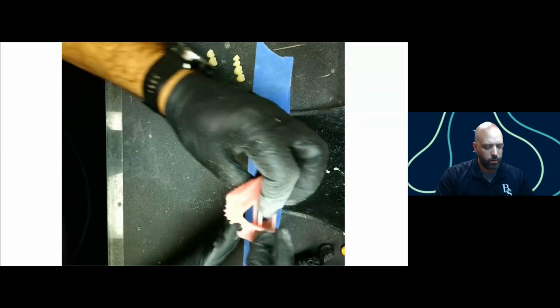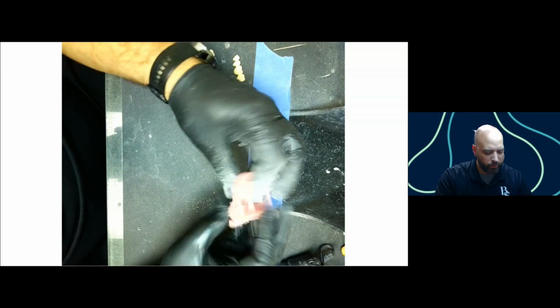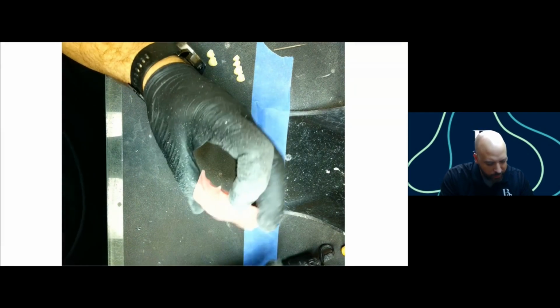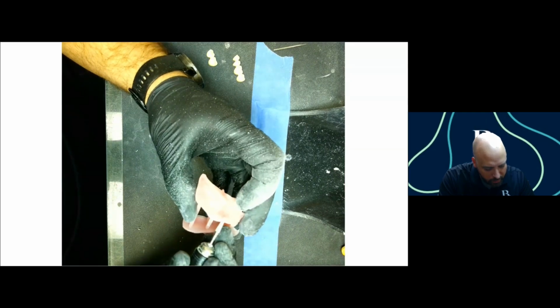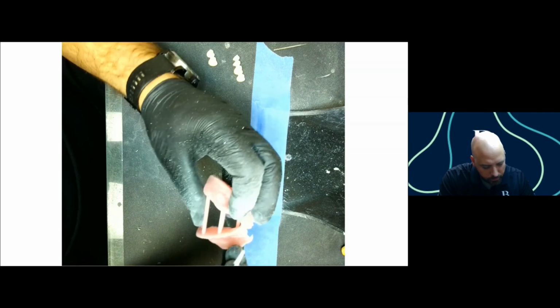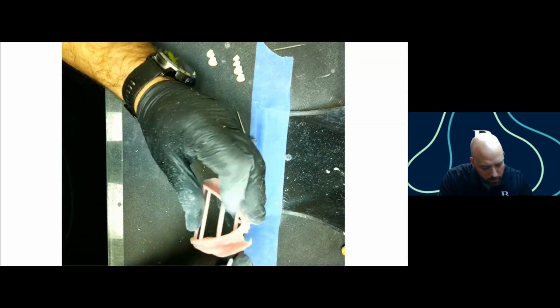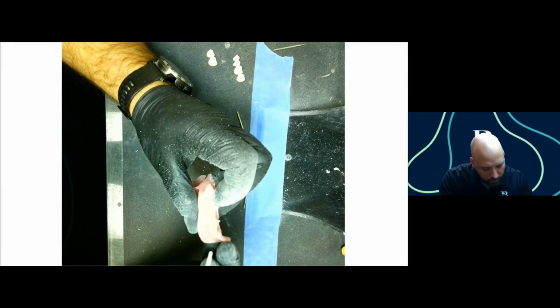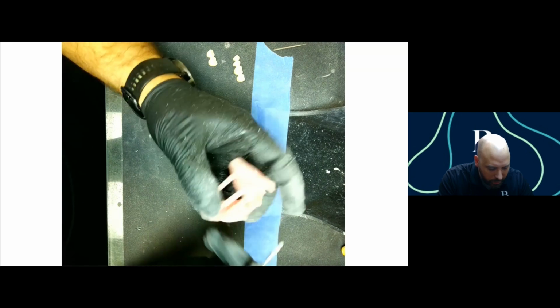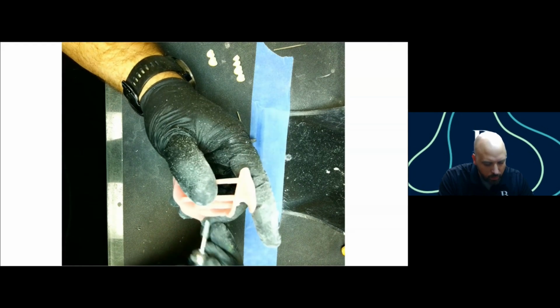All right. So now that I've got those all finished, this is kind of what my border or my base looks like. The borders are pretty well finished. Might touch a few little areas here. Kind of looking around for any little nubs that I can see from the connectors.